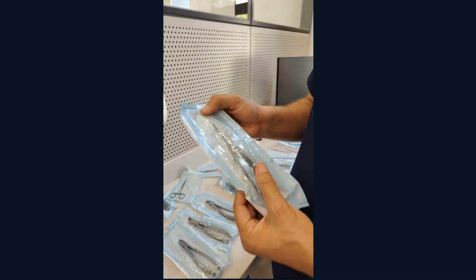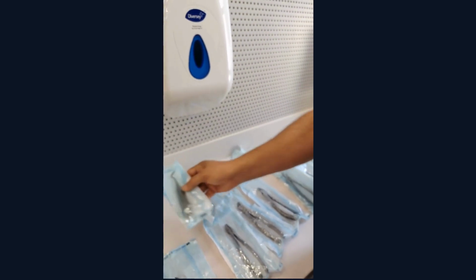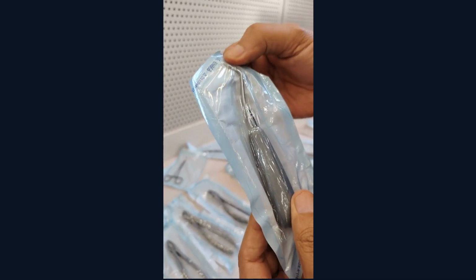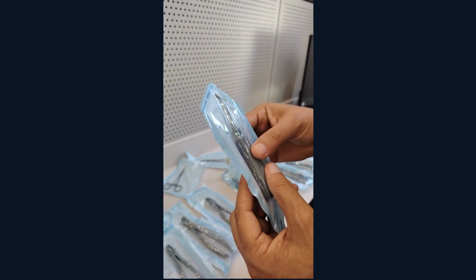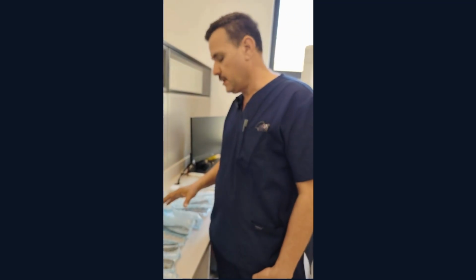Okay, elevators. We have the straight elevator. This is the straight elevator. Apexo elevator for the apex. Okay. This is the spade. It can also be used as a straight elevator. It's not straight. It's more of an apexo. It can work as an apexo, but I can also use it to move the teeth. Almost all of these that we have now, we can talk about next time. Thank you.